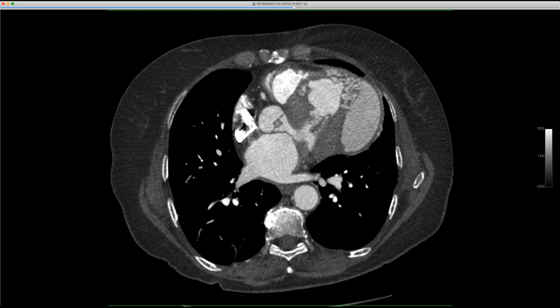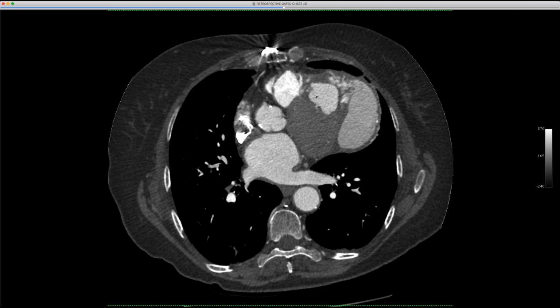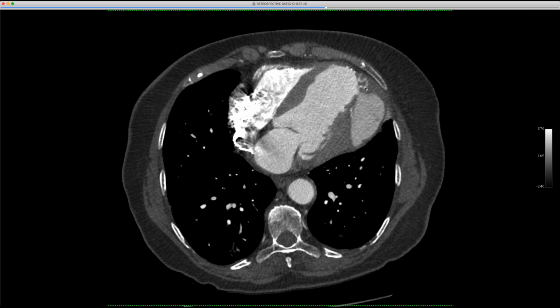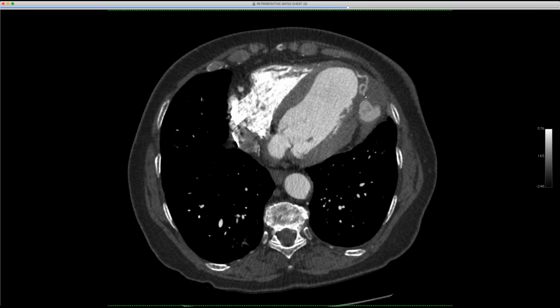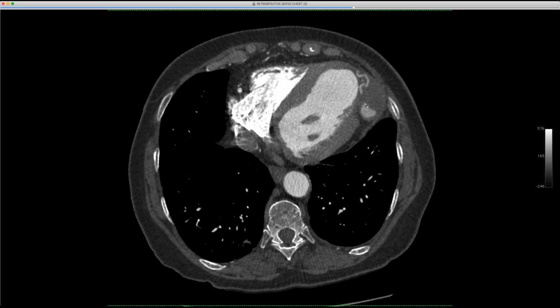Do you have a non-contrast? Because some of that almost looks like it could be an old patch. No, unfortunately I don't. This is definitely a patch around the RVOT. Yeah, but even some of that LV stuff looks like it'd be a patch. I agree. This is obviously a pseudoaneurysm. There's a narrow neck, and it's a crazy case. But that stuff near the LV apex almost looks like a patch as well. It does look like a buckle, and there's some calcium there too.